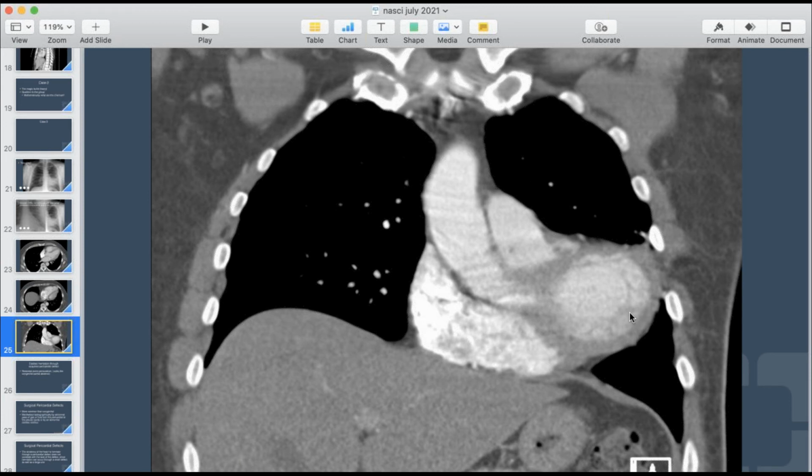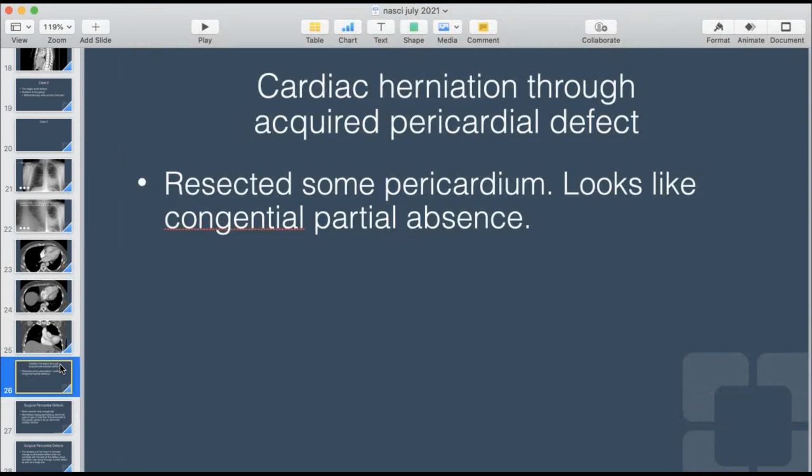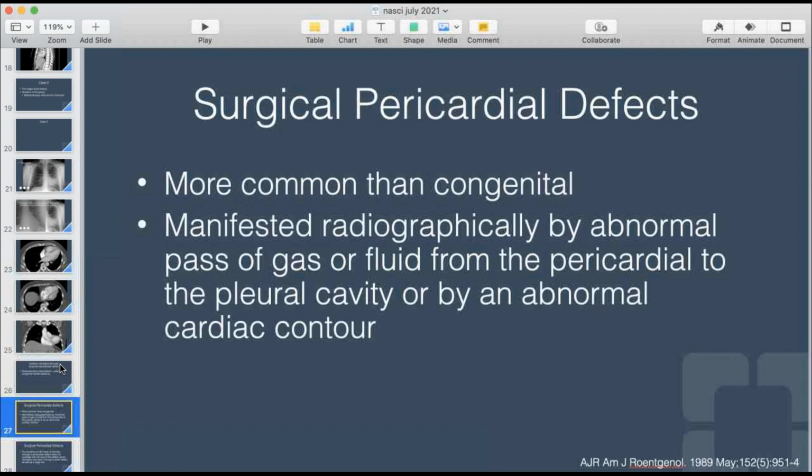Okay. So the other thing to notice is not just the upturn, but to check, in the next 10 chest x-rays you look at, the right cardiac contour of the heart. It's not rotated. The image is pretty symmetric. You should see the right side of the heart to the right of the spine. Every time you don't see it, and the right contours are either overlapping or moving to the left, you should be concerned that there's some shift of the mediastinum. So there's upturning plus some shift as well. I'm going to show you.